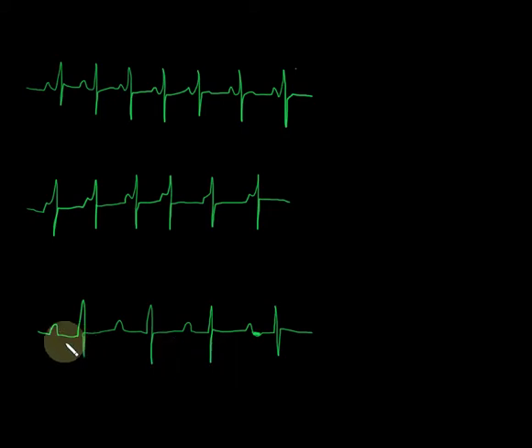However, if you look at the PR interval, if I told you that's a 3-block or 4-block PR interval, and that's like a 1.5-block PR interval, this is like a 6 or 7-block PR interval. So this is a really long one. It's basically twice as long as our sinus rhythm here. So 6, 7 blocks long. And that falls outside of our norm. If the PR interval is consistent but short all the time, you got that 1-to-1, but they're all short, that's a junctional rhythm. Well, if this is extended and it goes beyond that length, then what we have is something different.